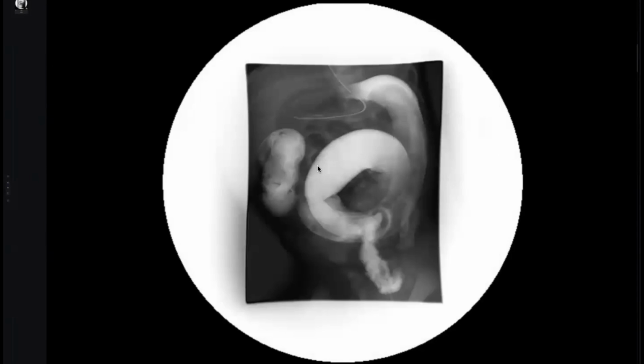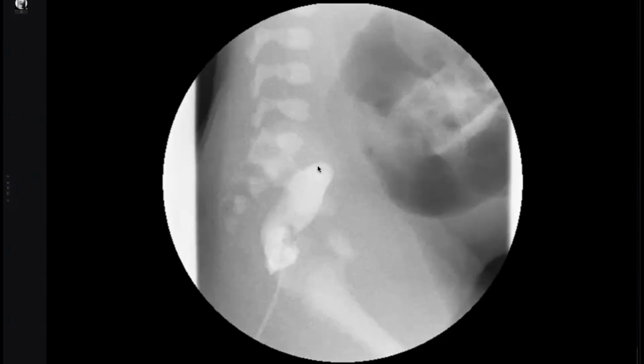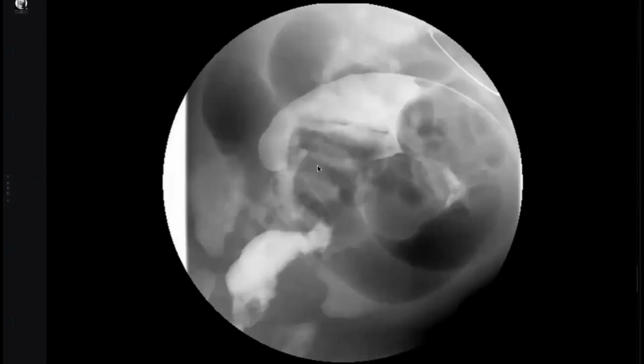Doctor, one second. Did you scroll through all the series? No, I didn't. So we must scroll. You didn't even ask me. Okay, this is the beginning. Tell us what happened.